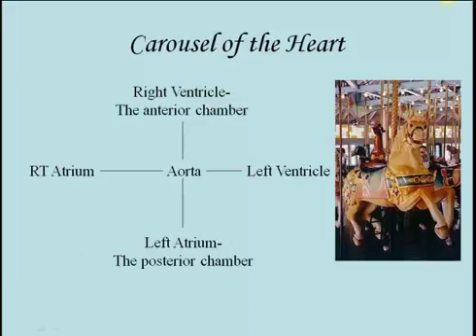Now, the septa that I was already identifying to you and outlining, where's that thing? All right. The septa is pretty much going along this way. Because remember, the interventricular septum is separating the right ventricle from the left, and the interatrial septum is separating the right atrium from the left.